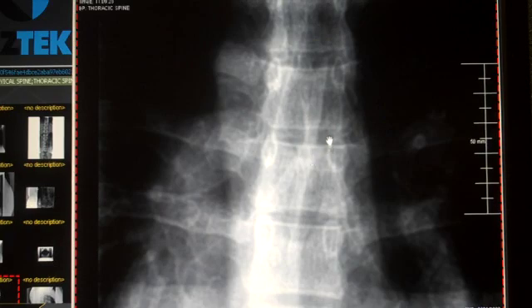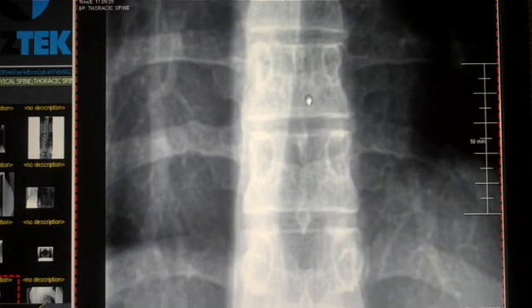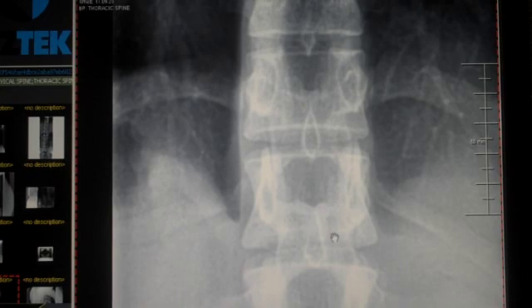If I move on down into this area, this spinous process is coming all the way down to here. This one's easy to see right there, but they're very flat in the mid-thoracic area. Now as you get into the lower thoracic area, this spinous process is the spinous process for this segment, and this spinous process is the spinous process for this segment.